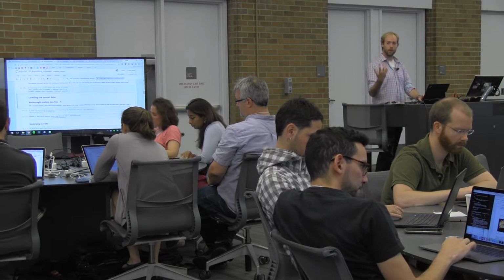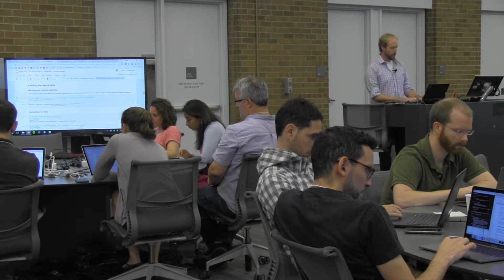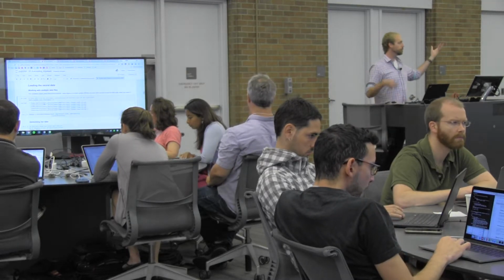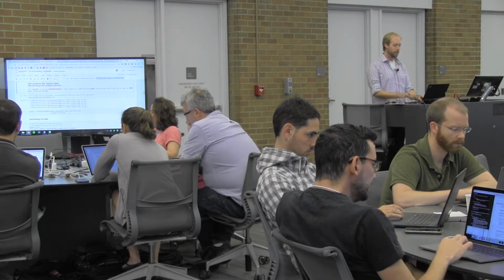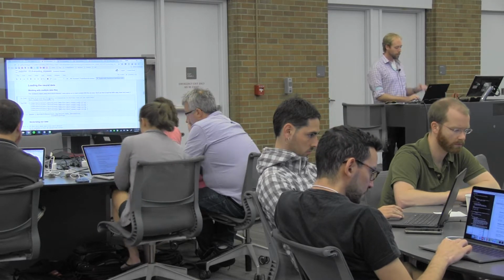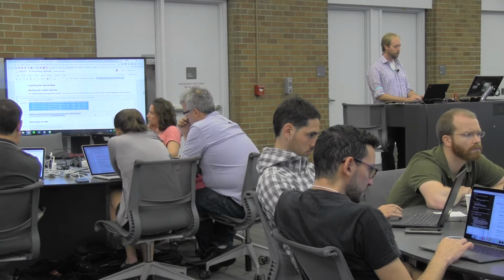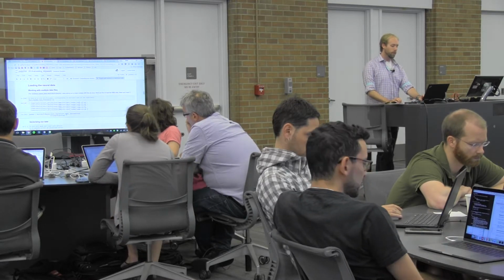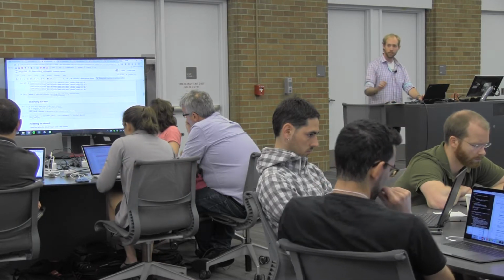Now we're going to start constructing the matrices that we need in order to fit these models with Scikit-Learn. I mentioned before that we had this NiftiMasker object which can go from volumetric space into samples by features space. There's another object called MultiNiftiMasker that, unsurprisingly, does the same thing with multiple Nifti files at once. Here we have a bunch of different files corresponding to different runs, and these just exist in a list in Python. We can use a MultiNiftiMasker with the mask that's been provided with this data set to operate across that entire list at once.